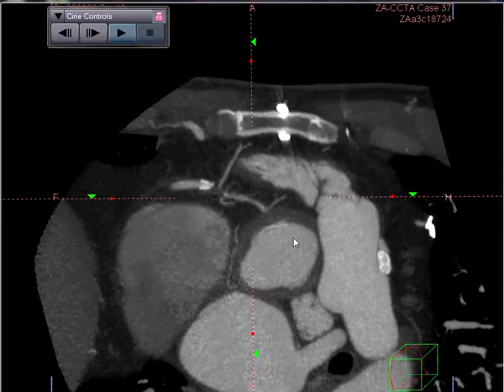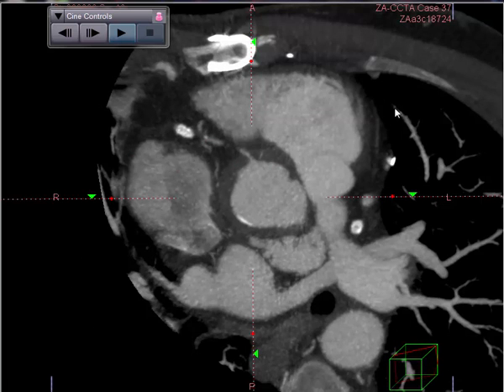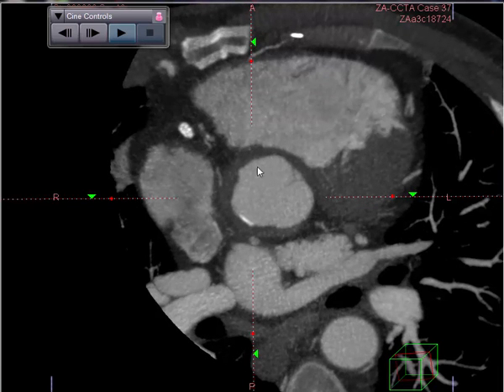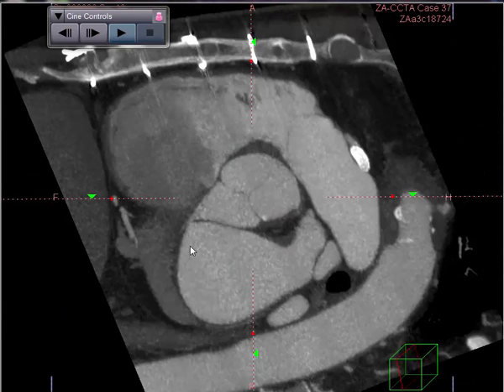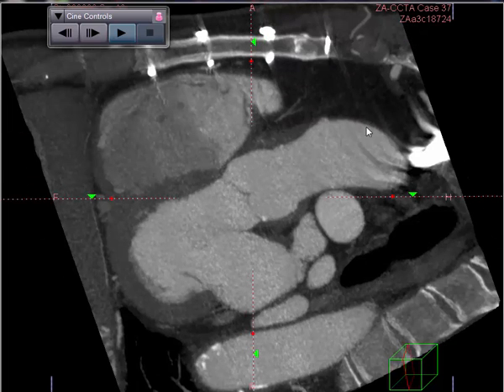Now you'll notice here as you start looking at that, there's a little bit of a collar around the aorta here. Now I don't have any more history on this patient. Frequently you are compromised with respect to total history on these patients, especially the bypass graft patients, if you don't have any operative history. But this is evidence of a prior dissection in this area. You can get a little better look in a longitudinal view, if you will. You can see again this collar around here. Again, I don't know anything about this patient's surgical history, but I would say that there probably also might have been an isolated dissection.